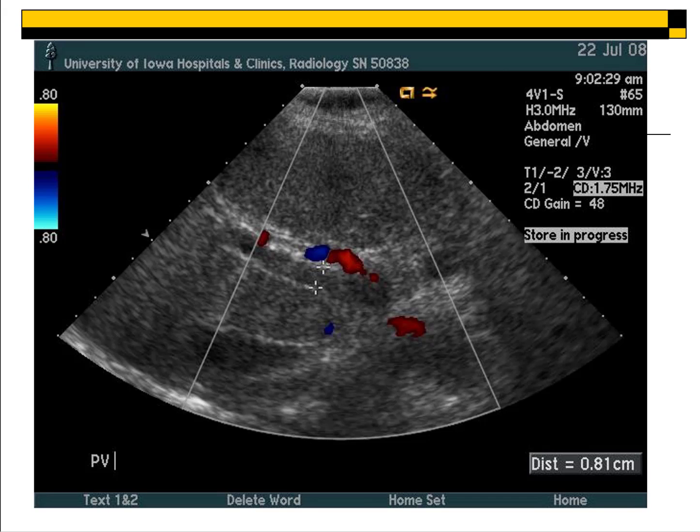We should show a spectral Doppler of this vessel here to determine whether or not that is the hepatic artery in this image. And I don't really see our cavernous transformation that you would see at the porta hepatis in a more chronically occluded portal venous situation, which I did say on previous slides takes up to a year to form. That is true.